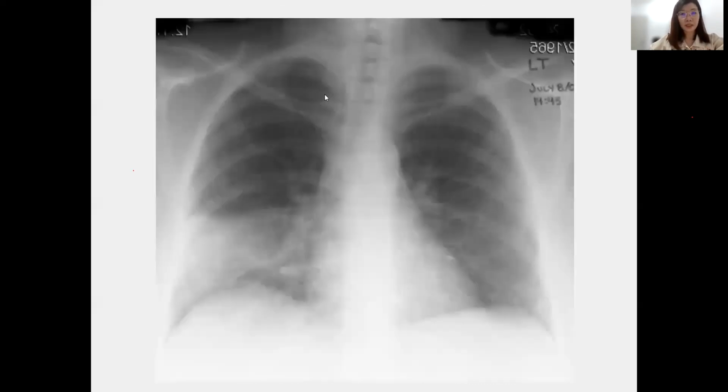So now this one again. This is a consolidation. Where is the location of this consolidation? The interpretation of location is almost similar to a collapse, but this one appears as consolidation rather than collapse. So from here, we can interpret lower zone easier and faster. If you want to be more accurate to tell the lobes, then you can try as well. Anyone? A middle lobe, right? No. Okay. So this is the right lower lobe consolidation.